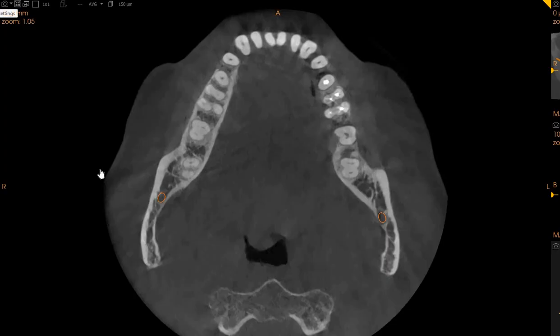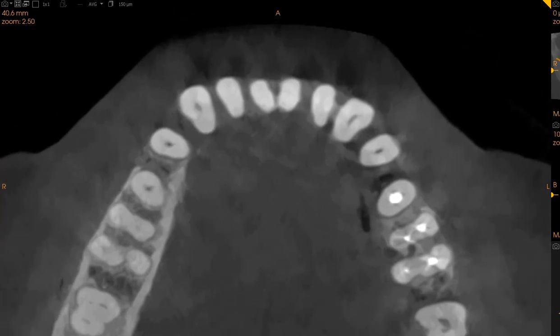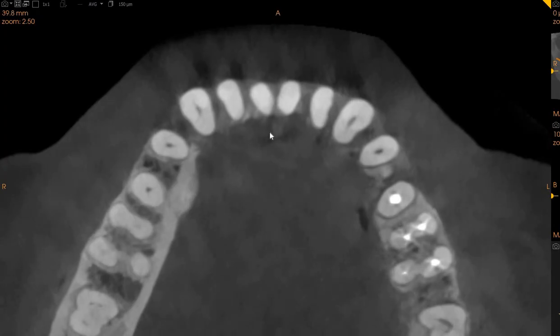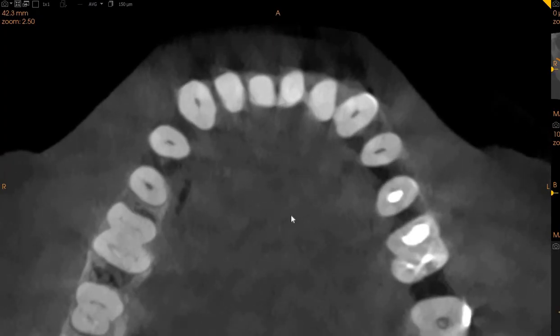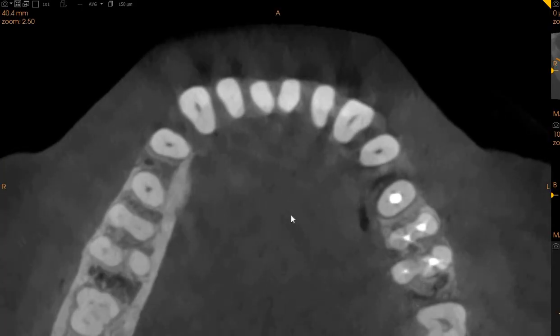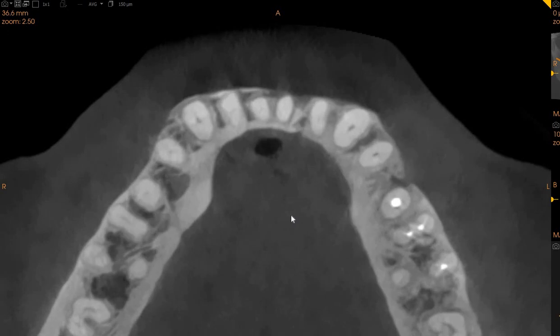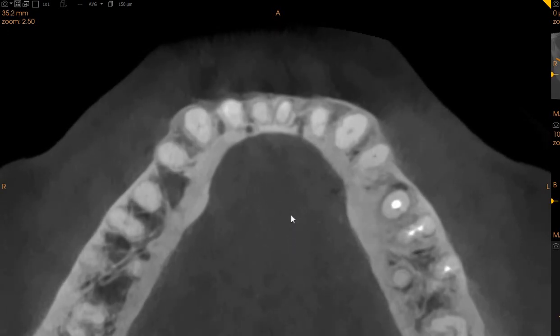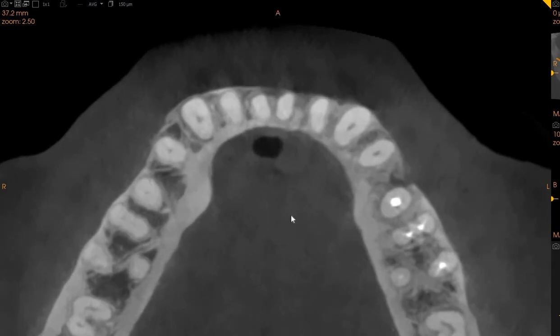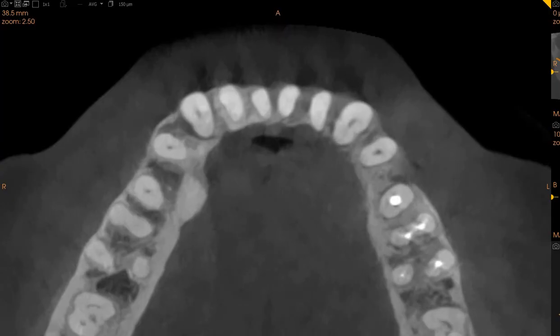So I'm going to zoom in for the kind doctor. There you go. So you can very clearly see in this CBCT that the central and the lateral incisors have very sclerosed canals. We don't see a canal architecture. We see it in the canine, but we don't see any architecture in the incisors, which proves the fact that endodontic treatment in these teeth is going to be a challenge, and extraction, while extraction, the amount of bone that we've described should be kept in mind.